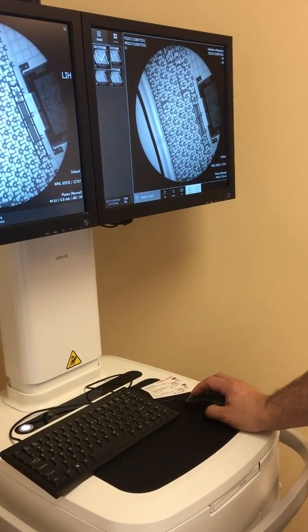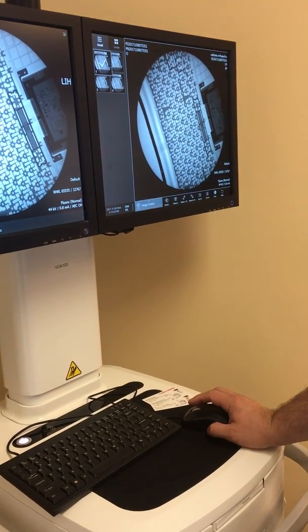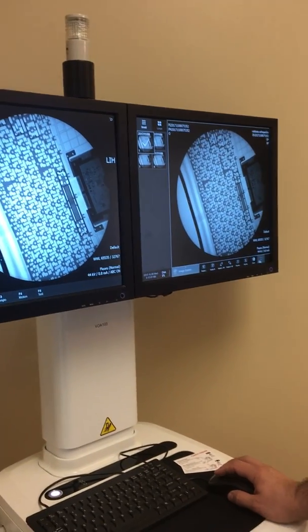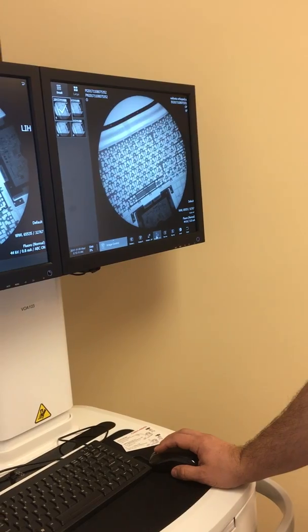Okay. Turn that off. All right, we can go to image control. These are the same image controls that we have over here, except they're for a saved image, and you know, we can flip and rotate and all that stuff.